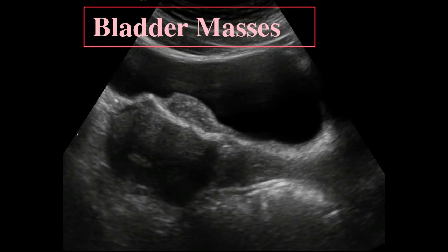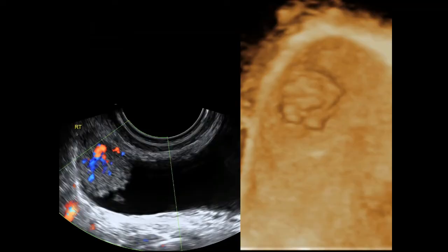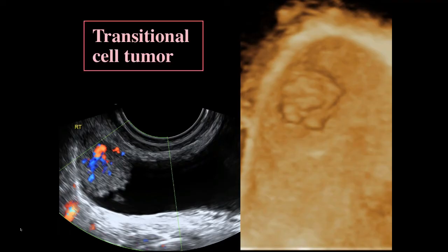Now, if you compare this to this, which is actually a transitional cell carcinoma, you'll see that this, in fact, is fungating, or it's clearly mucosal. It's got an irregular surface. It's got a lot of color. A totally different kind of thing. So this is a bladder carcinoma, or a transitional cell carcinoma.